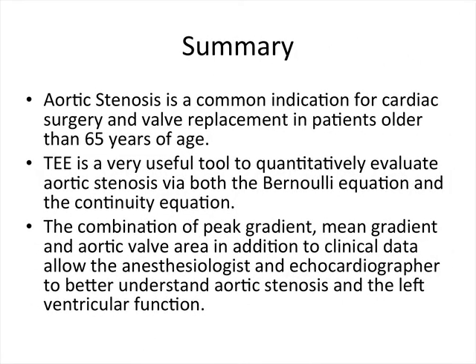In summary, aortic stenosis is a common indication for cardiac surgery and valve replacement in patients older than 65 years of age. TEE is a very useful tool to quantitatively evaluate aortic stenosis via both the Bernoulli equation and the continuity equation. The combination of peak gradient, mean gradient, and aortic valve area, in addition to clinical data, allow the anesthesiologist and echocardiographer to better understand aortic stenosis and the left ventricular function.